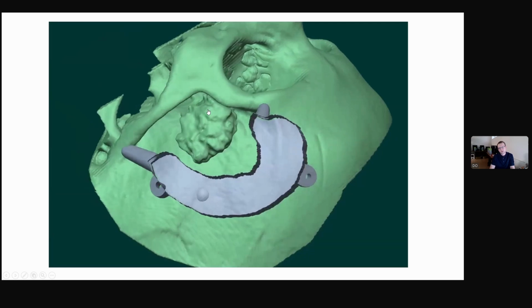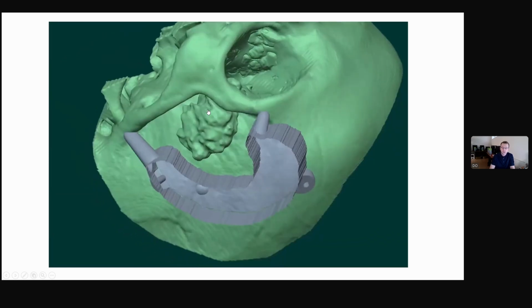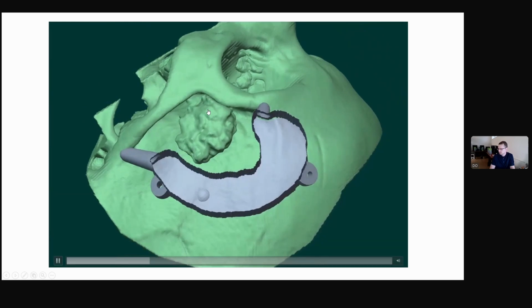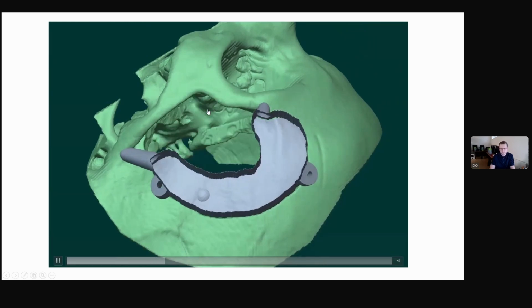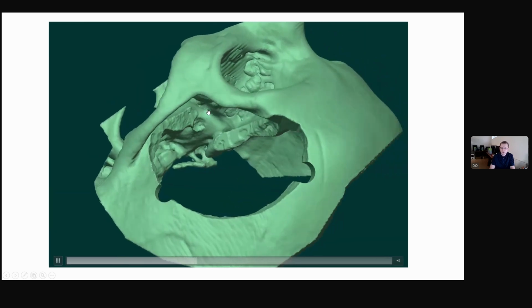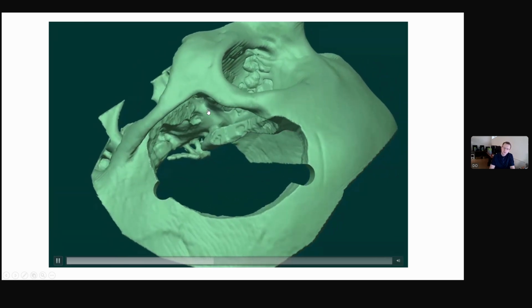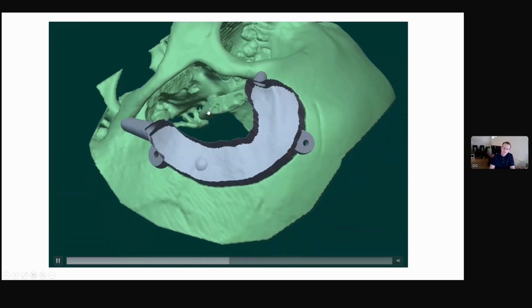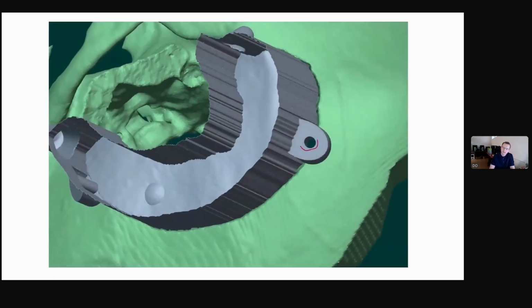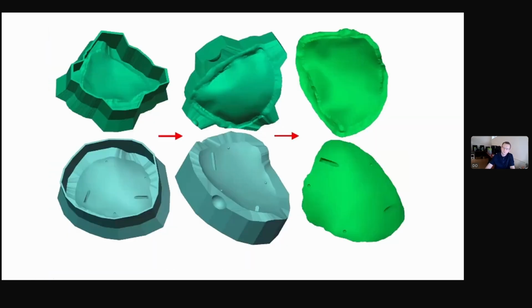For craniotomy for hyperostotic meningiomas or other pathology that infiltrates the bones, we can use surgical guides, and I can say that this technique has higher precision than even neuronavigation.